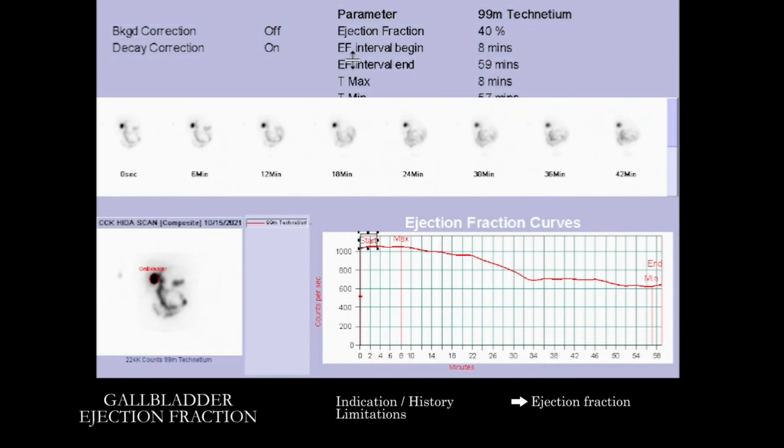We have some specifics here of when the activity was measured. But basically, if you do see abnormality, you're primarily thinking about chronic cholecystitis or biliary dyskinesia. There are some uncommon differential considerations, including sphincter of Oddi spasm, cystic duct syndrome, chronic acalculous cholecystitis, and medication side effects. So that's something you want to have a sense of when you're looking at the patient as well.